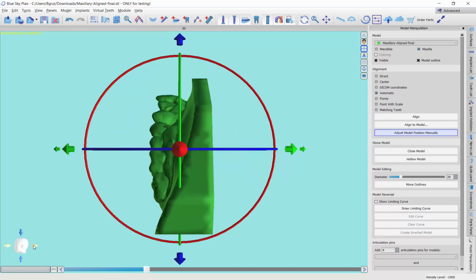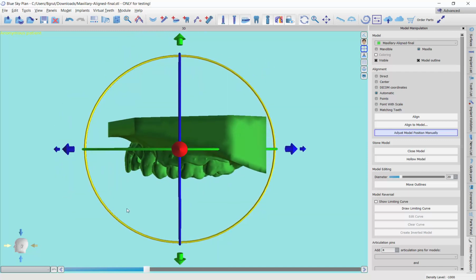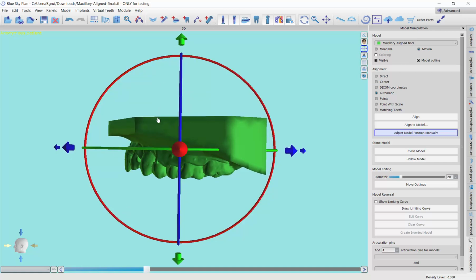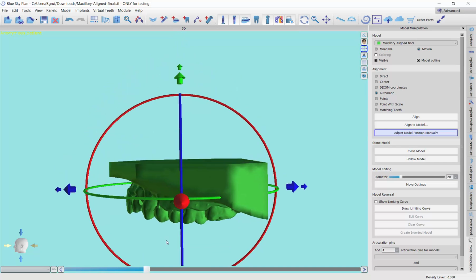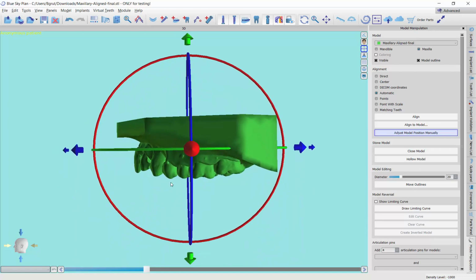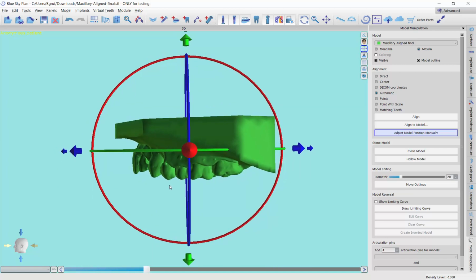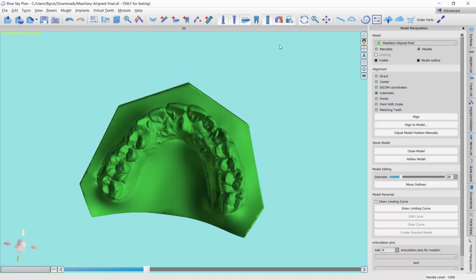And it's tipped back. So let's go ahead and rotate it down, essentially 90 degrees. It doesn't have to be perfect, but I'm looking at the pixelization up there. Okay, tell you what, let's aim to have the teeth in somewhat of a line, kind of parallel to the bottom of the screen here. Okay. All right, so that's it. So now the model is aligned a little better.